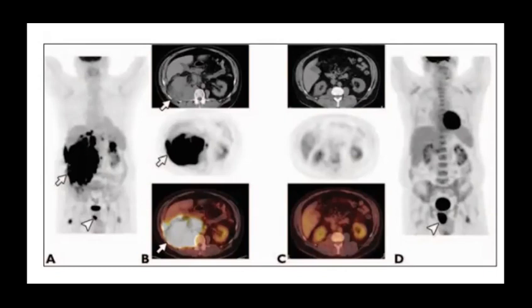So, yeah, Huda, welcome Huda. Nice show up with nice differentials. Thank you. So it can be what is called lymphoma. Yes, it is very common for lymphoma to involve the kidney and the retroperitoneal region. You will see it in practice much more commonly. And after treatment, you can see this marvelous response. That's why if you suspect lymphoma, you should put it in the top of your differential list.